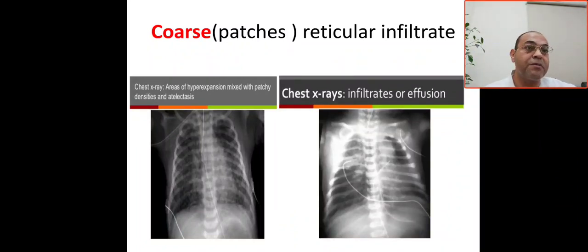If it is a premature baby, it is commonly RDS. If full term, it will be GBS infection. If this baby is complicated with pleural effusion, it is common with pneumonia. Pleural effusion is rarely seen with RDS. It may be complicated with pneumothorax.